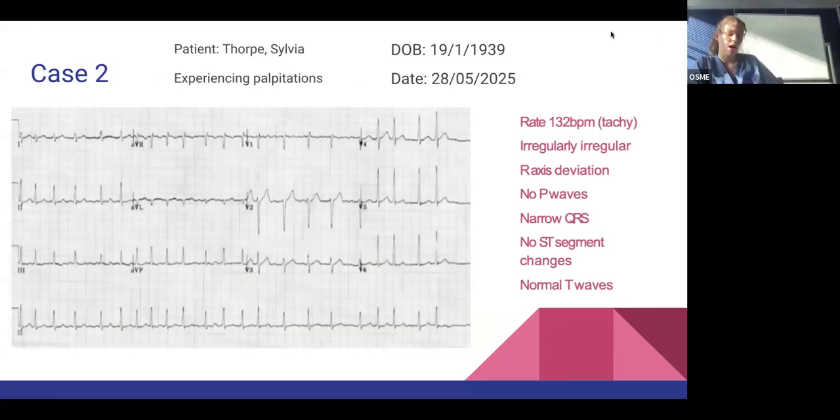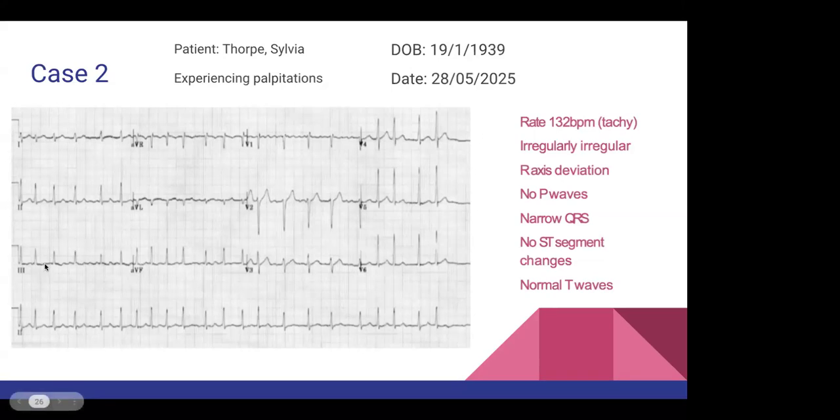Yeah. So mainly because lead 2 should be very much more positive than lead 3. If 3 is roughly equal, I can see why you'd go normal. And to be honest, you could go for either. It's a very minor right axis deviation. The main thing just being that you should really see a big clear difference between 2 and 3, which I don't think is really here. It's open to interpretation. Hopefully that helps. Great, thank you.